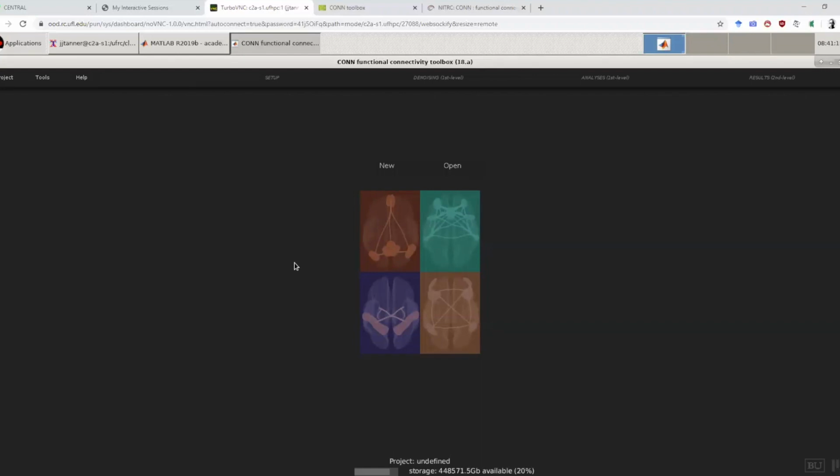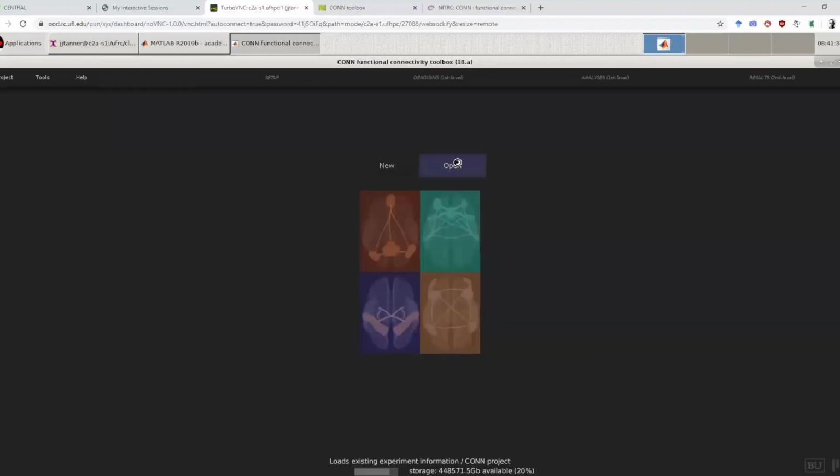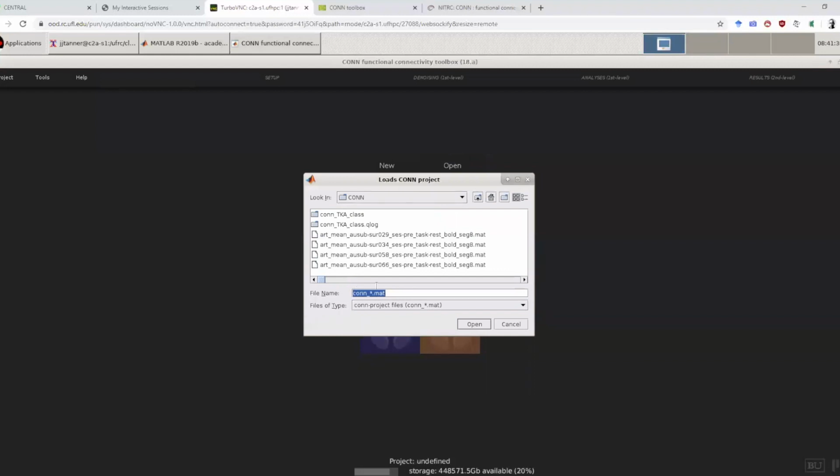So we're assuming now that you don't have a running console session, that you did the pre-processing and your console session has ended. And so you need to open up the project. So what I like to do, as I had shown already, is navigate to the location of the files, because then I just click open and we can open up the project.